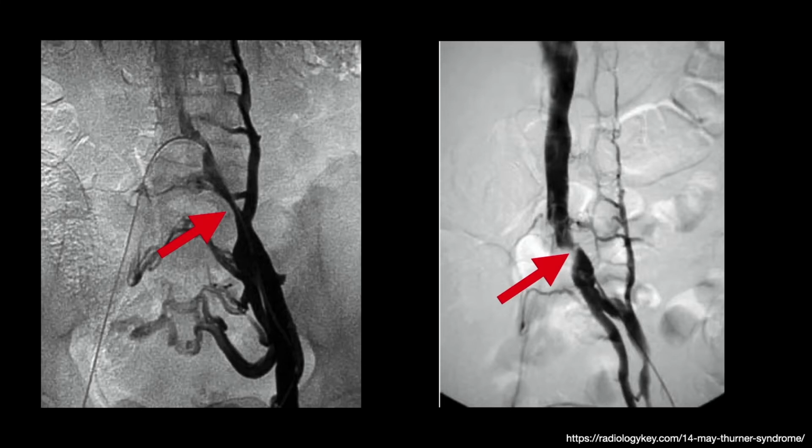But basically, contrast venography can also be used, right? The downside to this one is that it's invasive, right? You actually have to wire a catheter in, you have to inject that contrast, but you get a pretty good view of that stenosis that's happening inside that left renal vein, or left iliac vein. So here's an example of two pictures of contrast venography where you can see basically a pinching of that area in the stenosis of the vein. On the left, you see a lot of collateralization. On the right, you see less so.